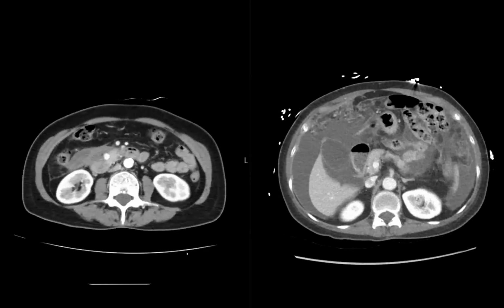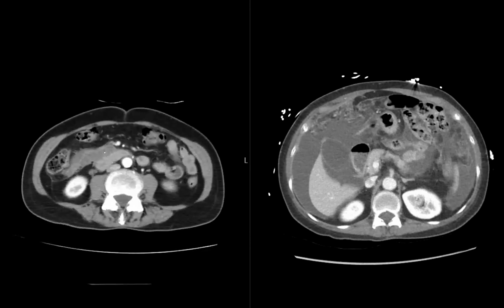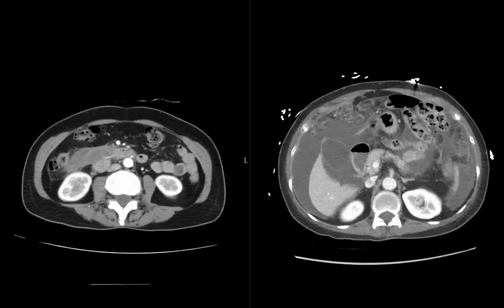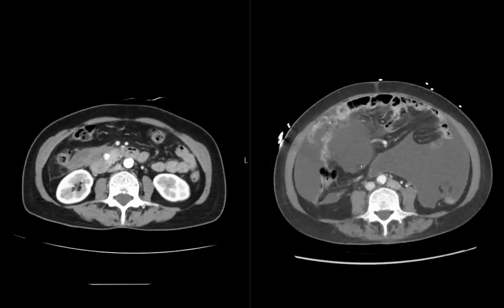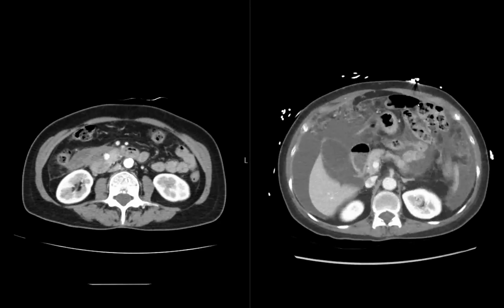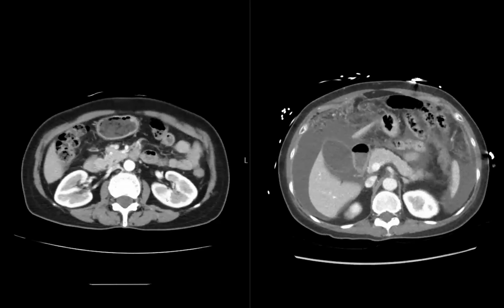I'll say that there's some findings on the new. Oh, the pseudoaneurysm. Oh, go ahead. Yeah, good. And also, what do you think about all this? Can you scroll to that area on the right, on the old one? Oh, it's all bleeding. Yes, exactly. So the pseudoaneurysm wasn't there, or we just couldn't see it because the timing was off? No, so the peritoneal disease and ascites is basically significantly decreased.